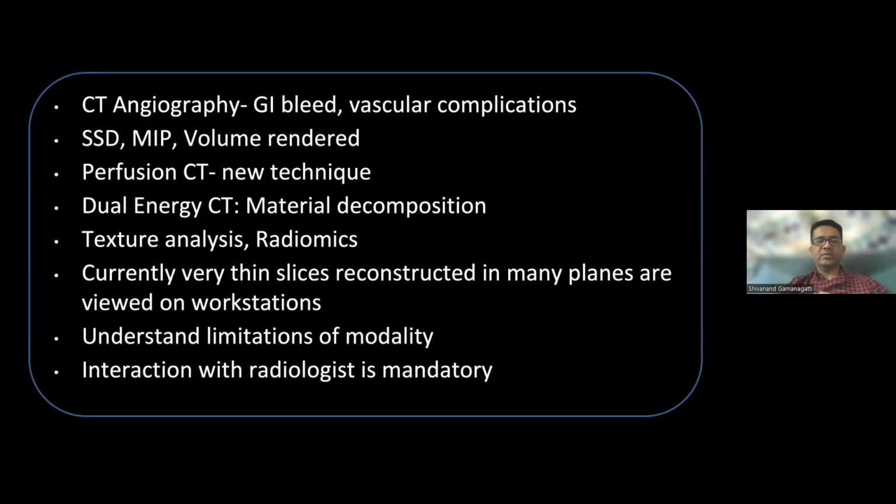I will not go into detail, that is very complex, but each has its own advantages. It gives you the roadmap and also helps to pick up the subtle vascular lesions, especially in patients with GI bleed or any vascular complications.